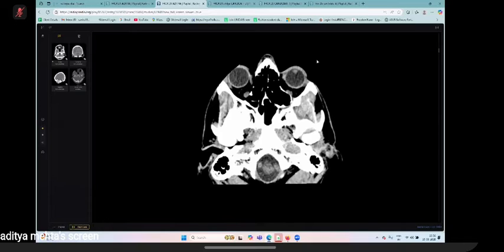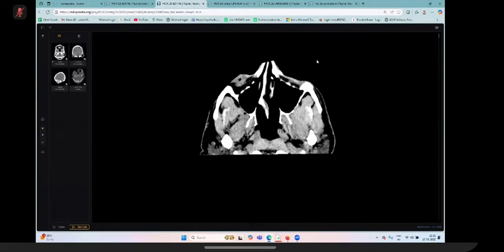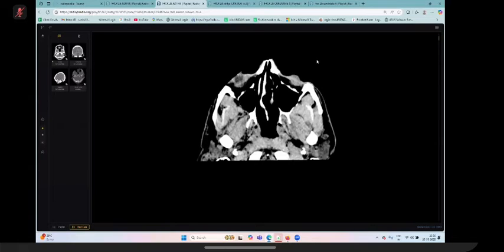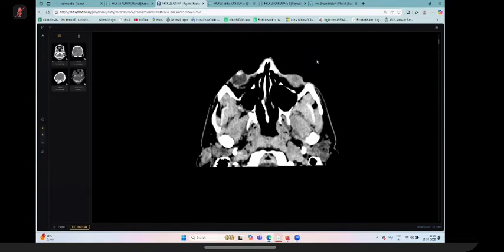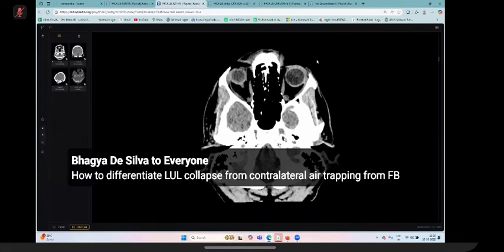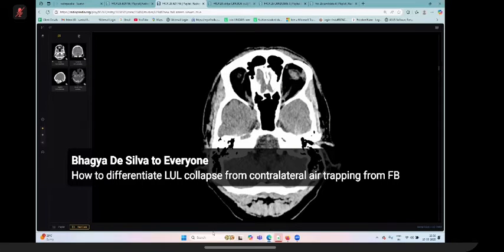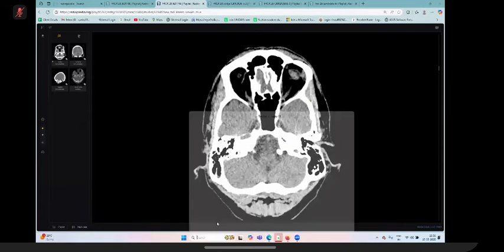In my first scroll, I was not able to pick anything, to be honest. So I will try to go for my review area, starting from the base of the skull. I will try to look slice by slice to rule out any possibilities.